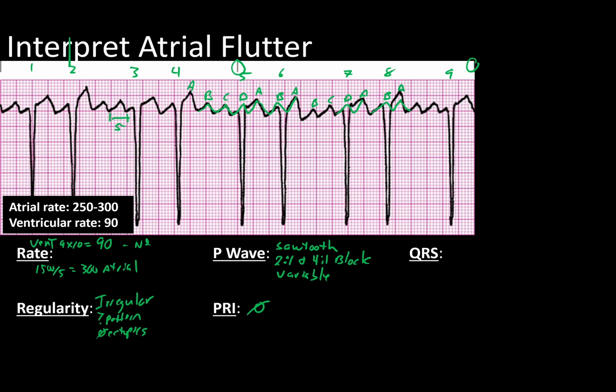QRS, they are definitely uniform and have a solid, actually no, we'll just say it's a QS pattern, and the width on those, it's a little bit challenging to mark out, but we'll say it's there and there, which is right about 2 boxes. Which again is normal.